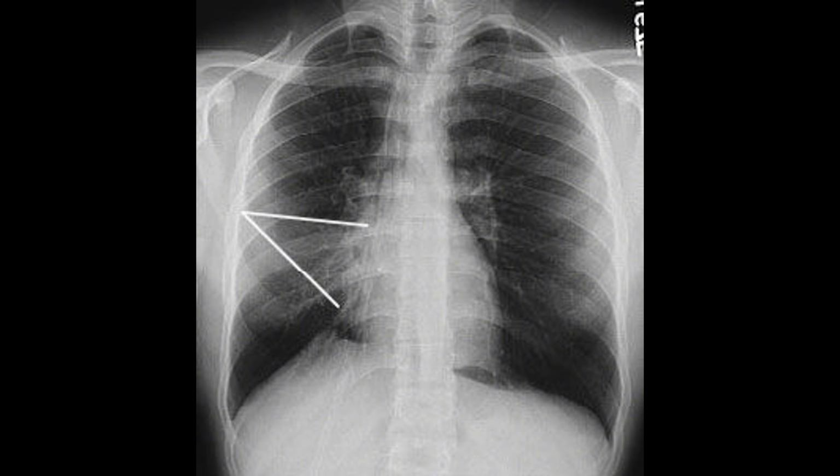Right middle lobe collapse is the lobar collapse least associated with overall volume loss because it is the smallest lobe in the right lung. Early collapse typically presents with loss of the right heart border, the silhouette sign. As the collapse progresses, the minor fissure is pulled inferiorly out of its usual horizontal position, leading to the triangular opacity on the lateral view where the major and minor fissures approximate each other.